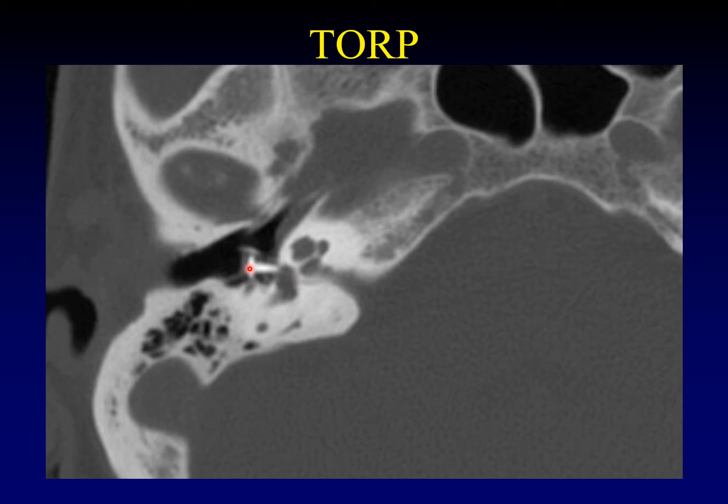And what you end up with is a surgical implant that looks something like a thumbtack. It's got a broad head, that's what attaches to the tympanic membrane, and then it comes to a point, and that point, it's not a sharp point, that point is where we have carved off the stapes footplate and replaced it with the prosthesis. There are many different brands, and they have slightly different radiologic appearances, but this is sort of the typical appearance for a total ossicular replacement prosthesis. Note that there is no stapes here. This prosthesis runs all the way from the tympanic membrane to the oval window. Total replacement.